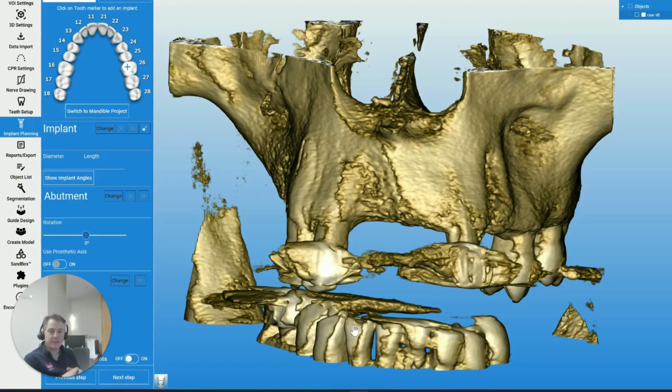One of the common things that we see during our QC step, which is a very important part of our process for our full arch guided service, is movement in the CBCT. I thought I would quickly show you this as an example. Typically this is seen in the anterior maxilla or anterior mandible, and when it gets to a certain level, the scan has to be rejected.